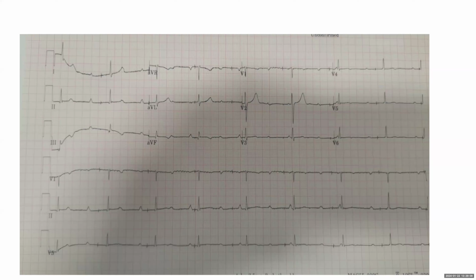Okay. Left atrial enlargement, I think that would be fair. I don't see clear STT, yeah, non-specific STT changes. Again, it might be correct, but there are other ones that are clearly correct, so I would go with these.